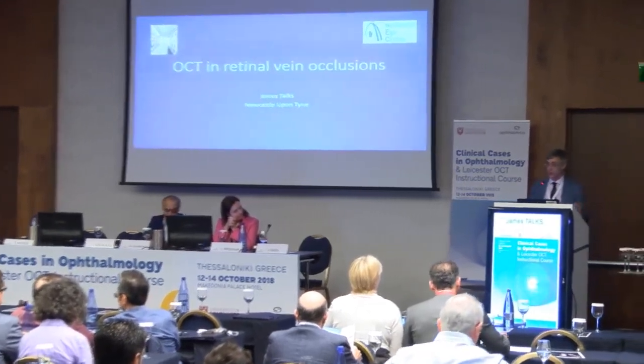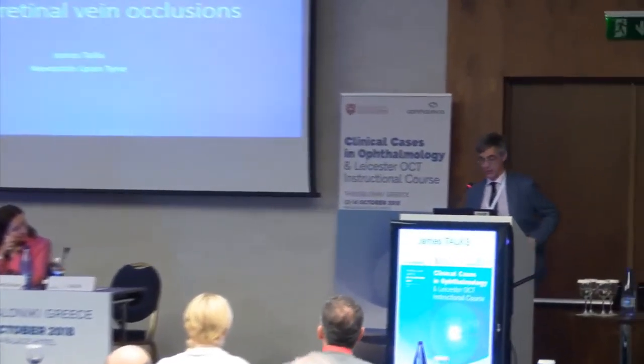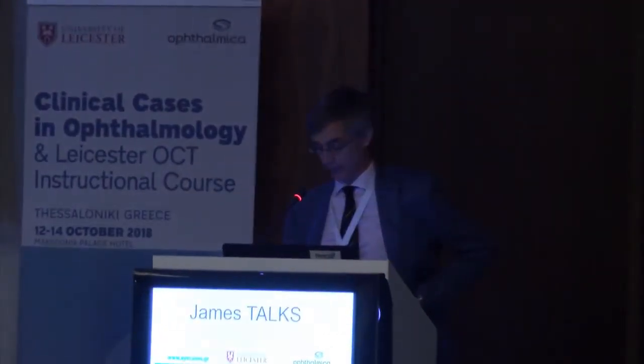OCT. There's a little bit of OCTA, but not so much on the OCTA this time. I was asked to talk about OCT and retinal vein occlusions. And as before, there's some Optos images and mostly Heidelberg images.